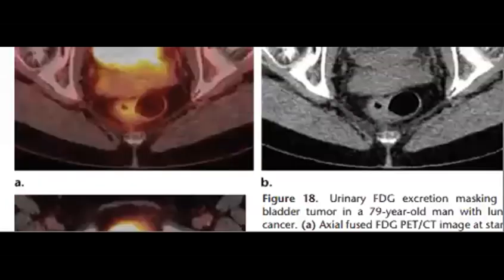So they take another image. Yes, I'll show you this one now. So what happened here? It is like a delayed image. Sorry, they didn't make a delayed image.